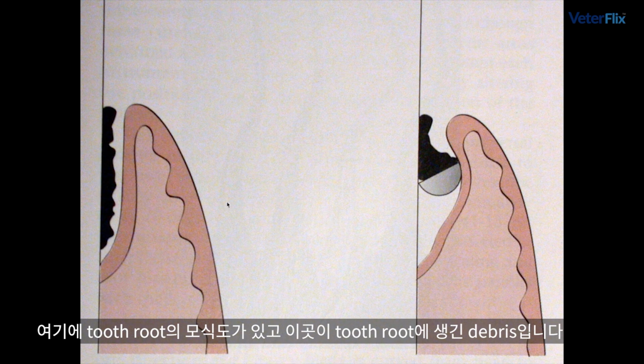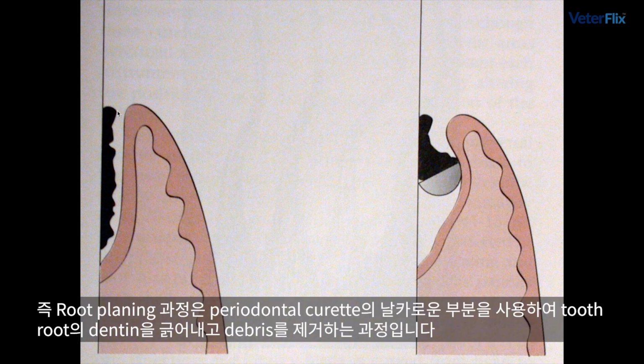So here's a cartoon depiction of the tooth root. Here's debris on that tooth root, and so the root planing portion of that procedure is by taking that periodontal curette, using the sharp edge and literally scraping that dentin on that tooth root and eliminating that debris to clean that out.